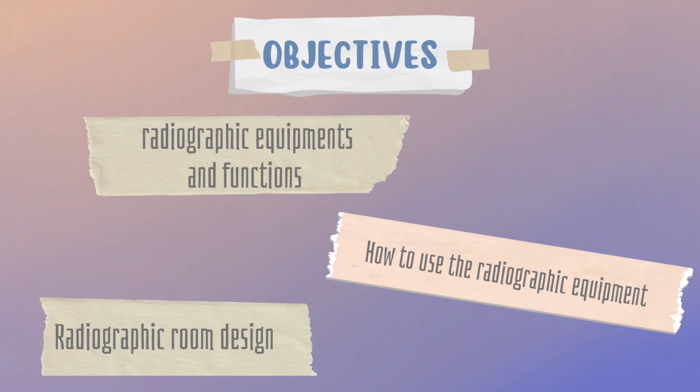There are three main objectives that we're going to introduce in this video. The first is the function of radiographic instruments, the second one is the demo of how the instruments are used, and the third one is the design work of an X-ray department.